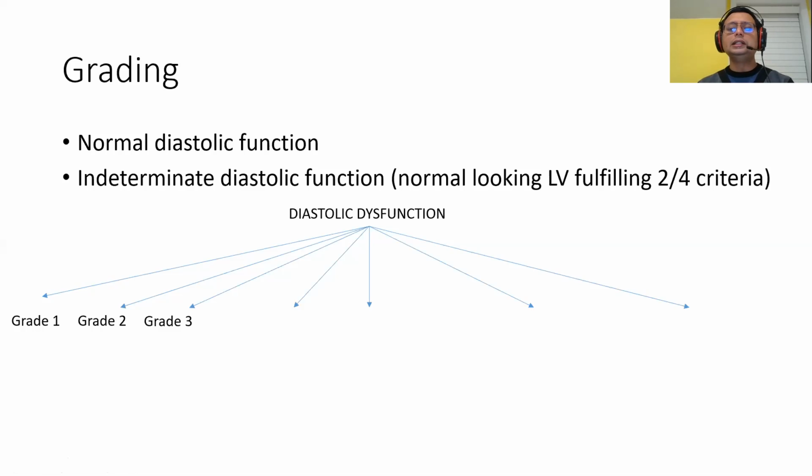For example, this patient with atrial fibrillation has diastolic dysfunction and normal filling pressure, one variety. Another variety is this patient with atrial fibrillation who has diastolic dysfunction with elevated LA pressure. We cannot grade them because they don't have separate E and A. So either you have fused EA with increased left atrial pressure, or you have fused EA with normal left atrial pressure. Okay, and obviously people with atrial fibrillation can also have normal diastolic function, right?